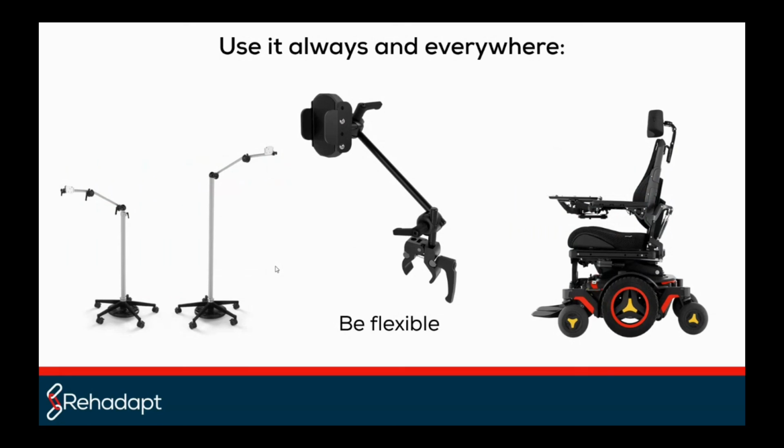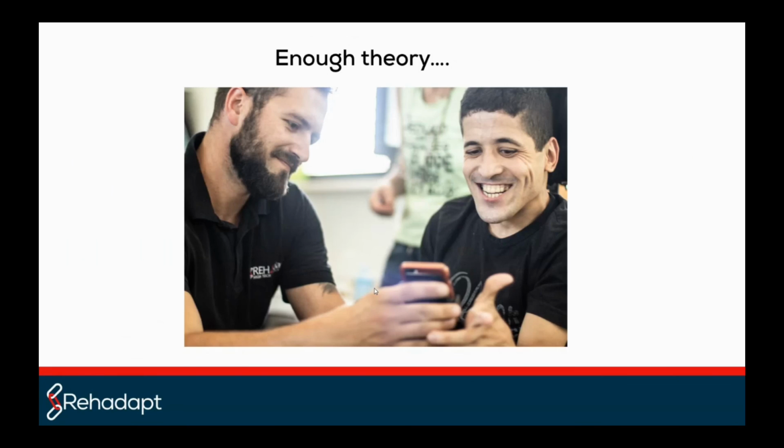So you are very flexible to switch from a wheelchair to the bed, to the table, to allow access to the tablet system wherever the customer is located.